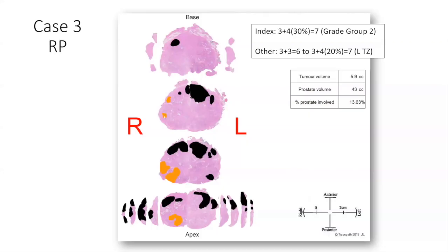So based on that biopsy, we went ahead with a radical prostatectomy. And Andrew, perhaps you could show us that. Go straight to that. Yep. So this is the pictorial representation. So that large anterior lesion, and then the smaller right-sided, right mid peripheral zone index lesion, and also this lesion here is that left mid lesion.